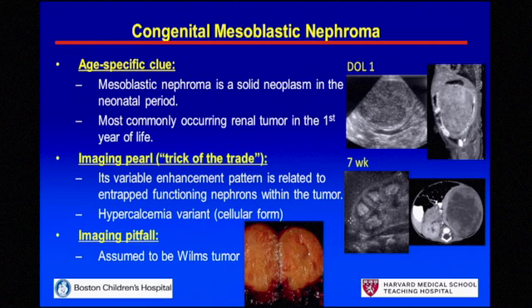As mentioned, these are generally in very young patients in the neonatal or even prenatal period. You can see a picture on your right. This now baby had the fetal diagnosis of a large solid mass in the abdomen. This is the mass. You can see it deviating the aorta off to the side and the branch of the iliac arteries. On cross-sectional imaging, here is the mass and a claw sign. Solid, classic appearance presenting in the newborn period.